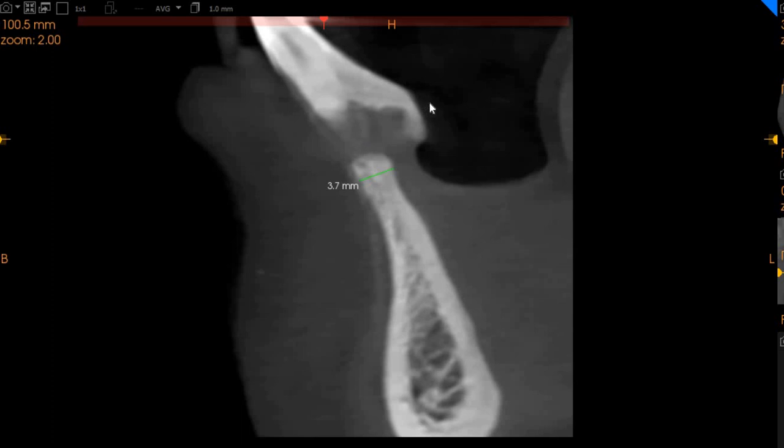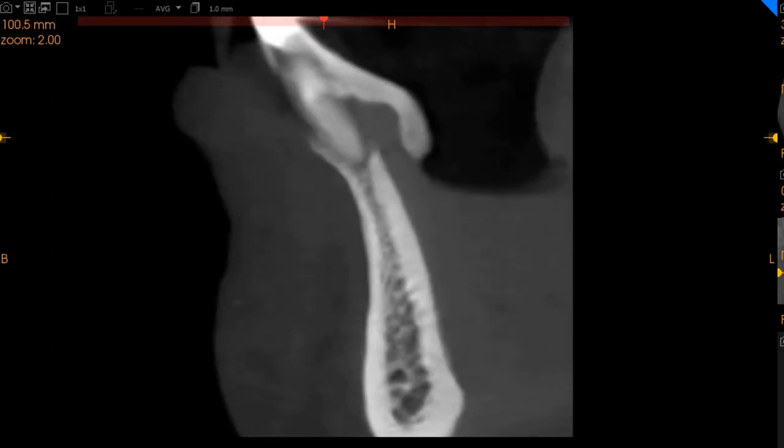So significant bone augmentation will be required in order for this area to receive implants in the future. So we will not advise socket grafting. We will not advise just generalized grafting. We will advise that this region requires a bone augmentation using a titanium mesh, so that a significant vertical as well as horizontal bone augmentation can be performed. If you have any further questions regarding this case, we would be extremely happy to help.